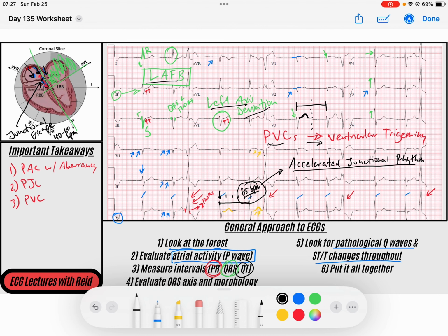I hope this video helps you work through this rhythm. It's a fun one. Big thing to think about is, why is this person's sinus node not beating? I don't see retrograde P waves that would be stunning the sinus node in this case. So what is their history? Does this person have sick sinus syndrome, sinus arrest? All the questions you need to be asking yourself.